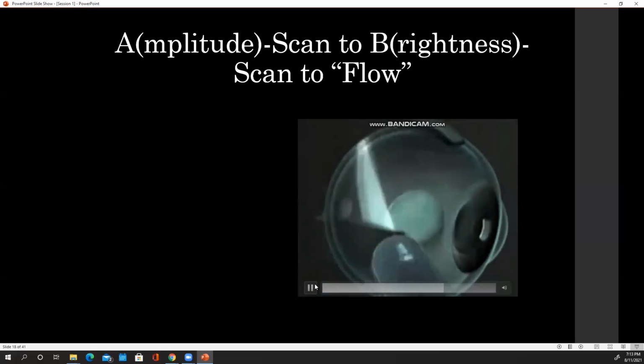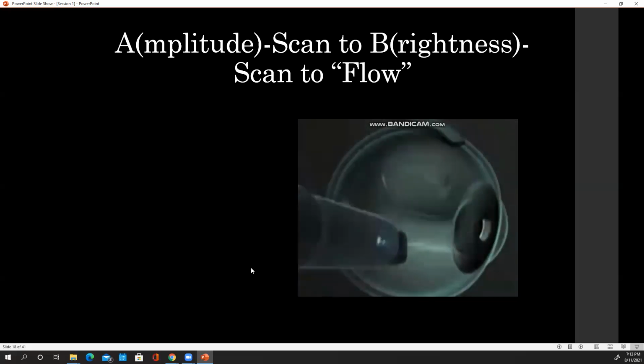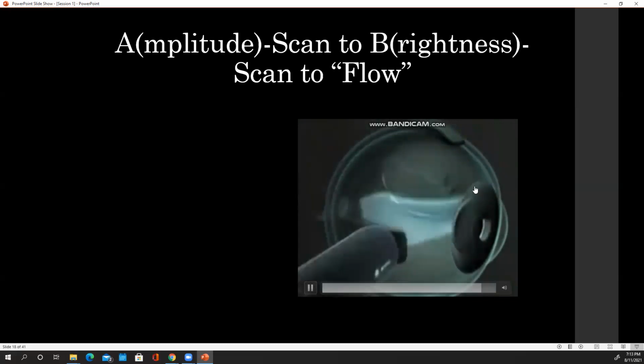Yeah. Okay. And so if you imagine this is one B scan, then the second B scan, third B scan, all the way up to 216 of those. So 216 B scans create one of these cubes. Okay. So remember, you can go this way, or you can go this way. It doesn't really matter, but you're still getting all of the information, right? So that's the cube that's being given.